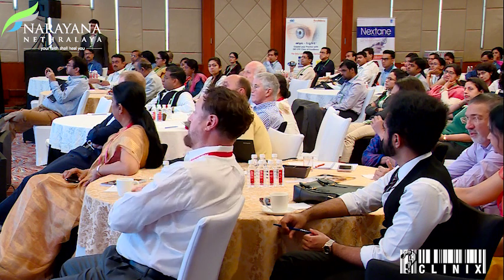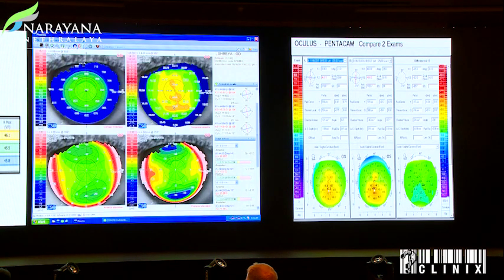Can I just quickly show a couple quick things. This is an example of what I was talking about. This is a 15-year-old with 13-month follow-up. If you notice, I've enlarged the Kmax. The Kmax on 3 exams over 13 months was 46.1, 45.5, and 45.8. So again, shows no real change. But if you look at the progression graph, again, we're way past the 95% confidence interval on the posterior surface. So this is true progression in spite of Kmax.